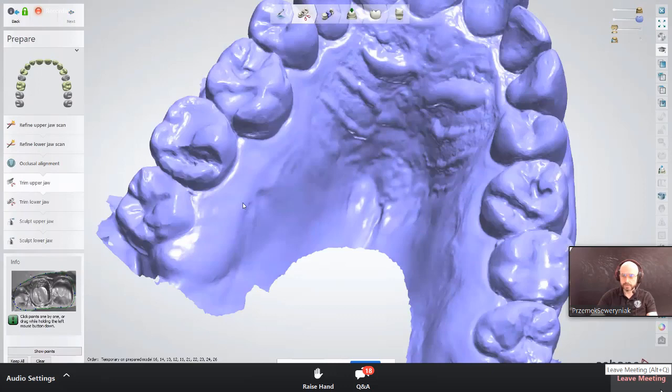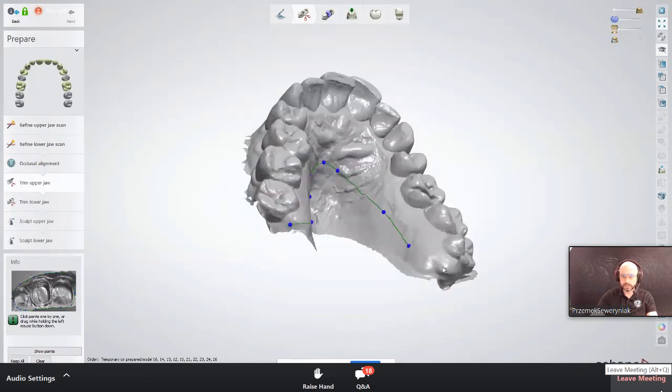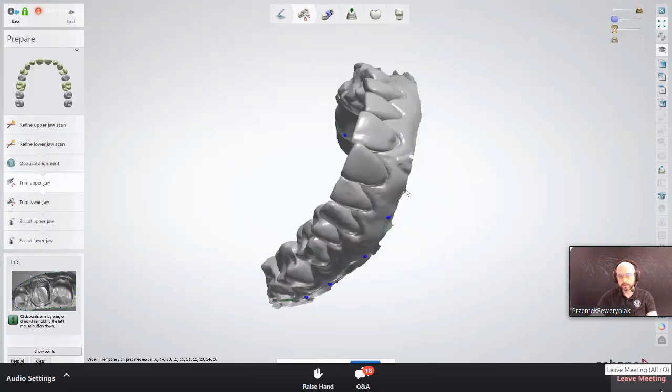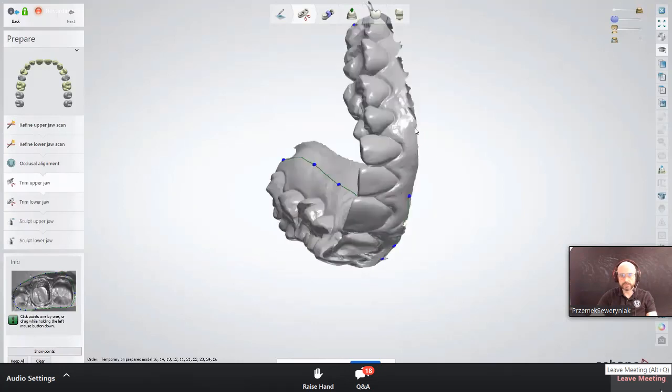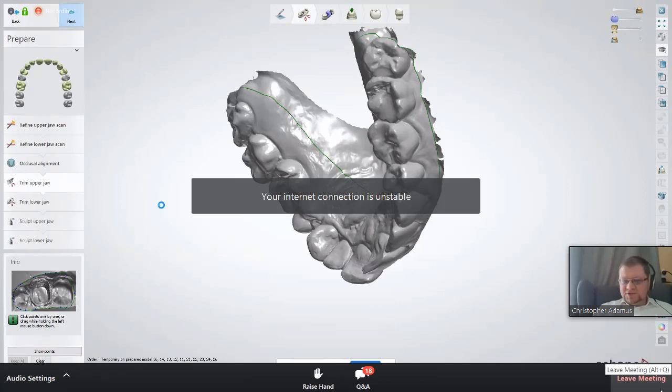I also like to work without the color on because it's easier for me and you don't get so tired in the eyes during the day. The color is mostly used when looking for margins that are not 100%, in my opinion anyway. So since you're trimming the model, maybe we will add 2 more questions.